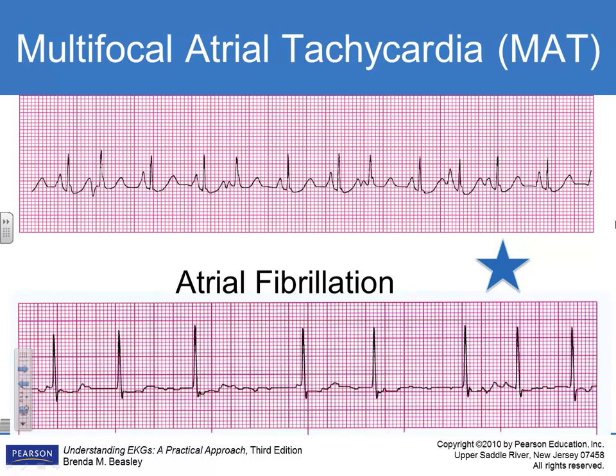Yeah? I guess maybe 1, 2, 3, keep going. Is that 2 atrial beats there? No, this is where you're repolarizing and it's late. This one's early, so it jams it close. Yeah, it looks like 2 P waves, but it's not really. It's only closer.